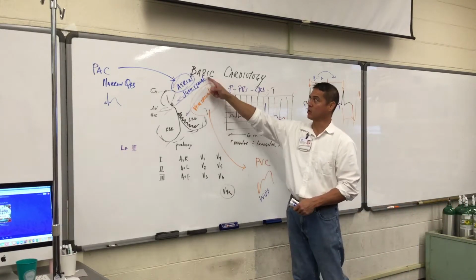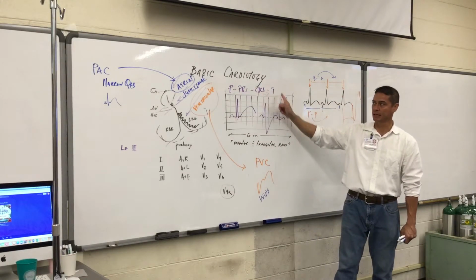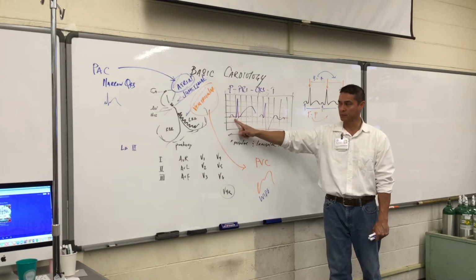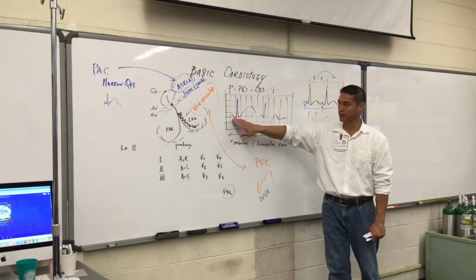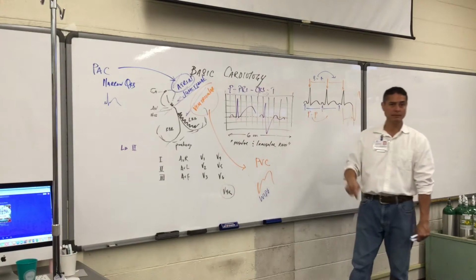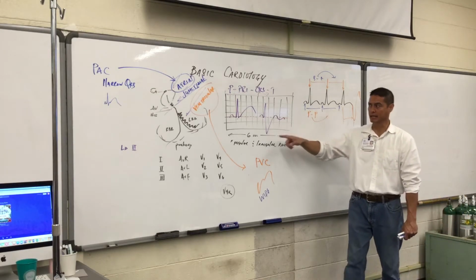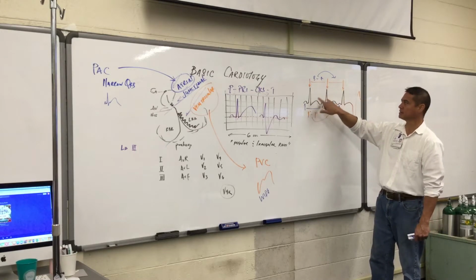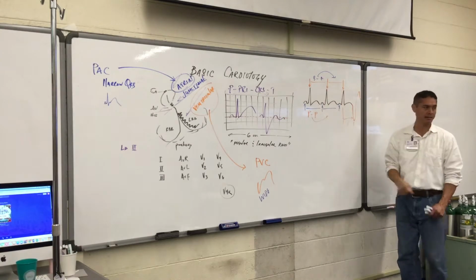What we want to basically know, basic cardiology, is that we're looking for P, PRI, QRS, and T. The P wave is early. It's before every complex. There's a PRI interval. This P wave is usually upright. It's not very large. The PRI interval is usually short, very unnoticeable. There's a QRS complex, which can be narrow or wide, and then there's a T wave. And these things march out. They're very regular all the time. The P's and the R to R's here measure out exactly identically the same.